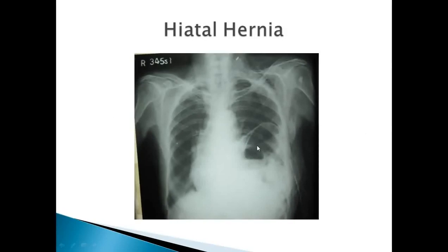E is for effusions. So you're going to look at the pleura, and the pleura is on the outside here. And you're just going to want to make sure that there's no spaces in between there where you're seeing either air or fluid.